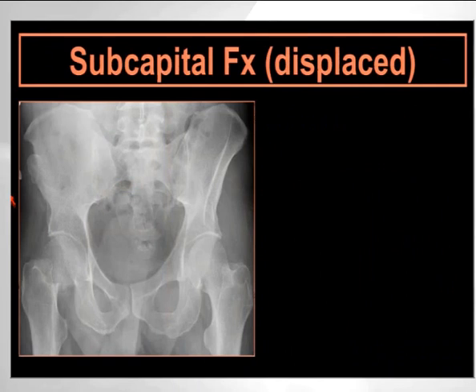So let's see, this is the classic appearance of radiograph in the emergency department. There is external rotation, and despite external rotation, we see a fracture. There is no femoral neck. I don't see any femoral neck because there is foreshortening. Typically, the greater trochanter rotates externally, and there is pulling of the shaft, and you don't see the neck.